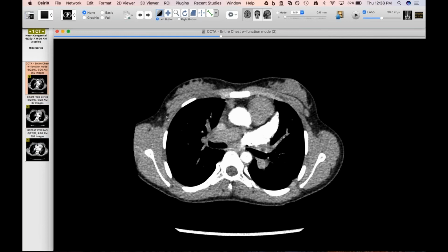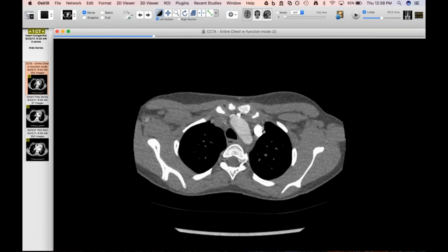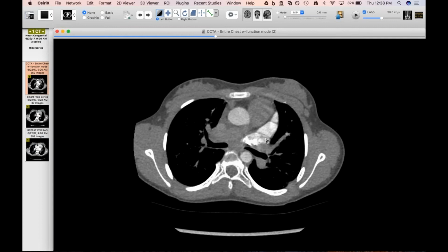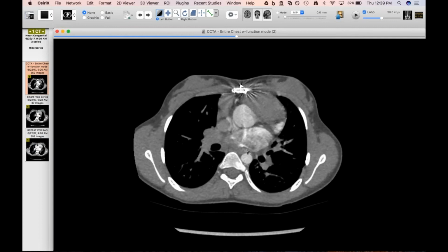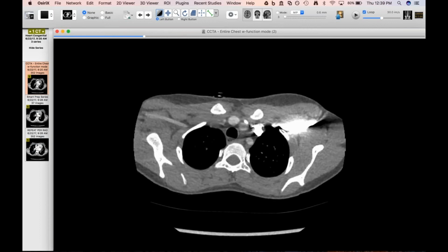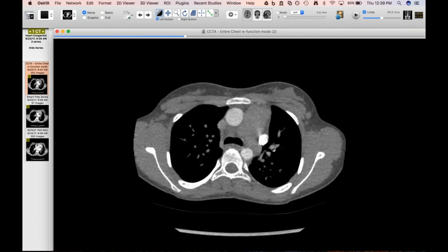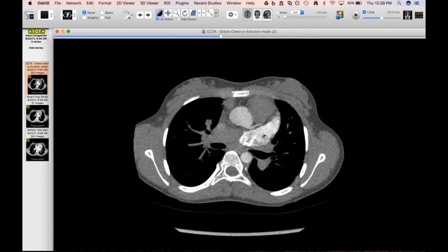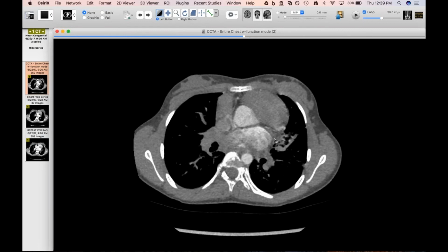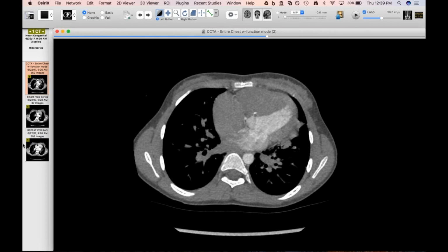So here, when we actually look at the study and we see this arterial phase, it's because, as you might have guessed, she has bilateral superior vena cava, and her left SVC drains directly into the roof of her left atrium. And so we fortuitously injected through her left upper extremity. There's maybe a tiny little, I wouldn't call this a brachiocephalic vein, but some sort of little vein that connects. But if we had injected through the right, we would not have seen this dramatic timing of the contrast. So this was an unrecognized, undiagnosed right to left shunt that was associated with, here's her VSD repair.